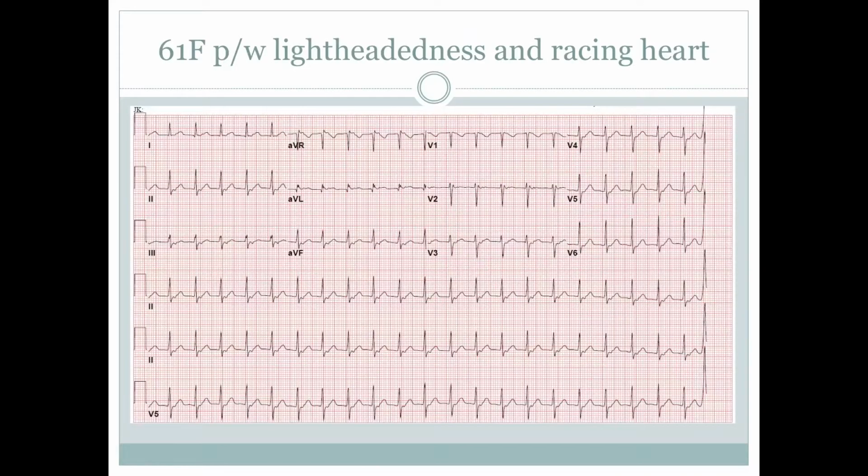Moving on to another patient. This is a patient that actually presented to the Jewish Hospital, and like our previous patient, this is a lady that had lightheadedness and a racing heart, and while she was symptomatic, she got this EKG, and you can see here that those small little ditzels after the QRS complexes are pretty consistent throughout the EKG, and then after she has those retrograde P waves, she has a positive deflection that makes up the T wave.